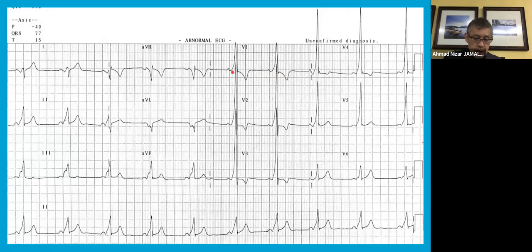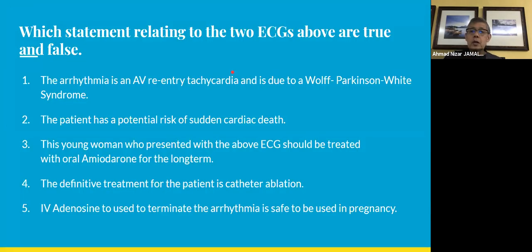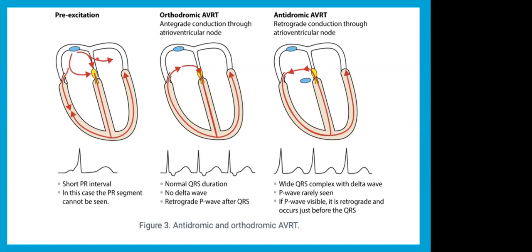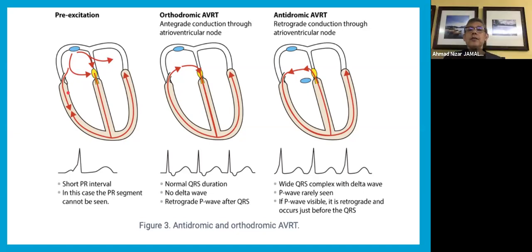Can we go to the figure, the next one? After the question, yeah, that will help. Okay. So if you look at sinus rhythm, the diagram on your far left, conduction travels to both the accessory pathway, which is on the right ventricle in this situation, as well as through the AV node, right? So there will be a portion of the ventricle that is excited through the accessory pathway. That is why it's called pre-excitation. So the slurred upstroke is due to that area that is pre-excited.